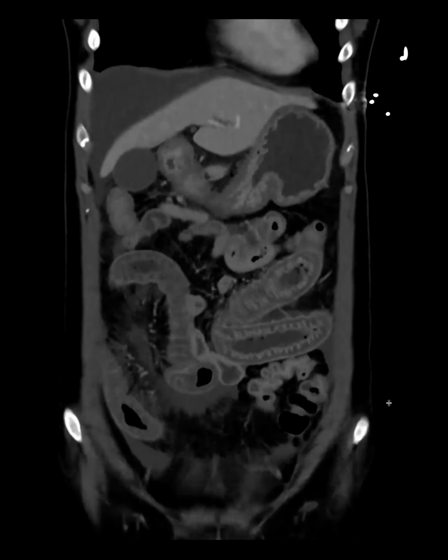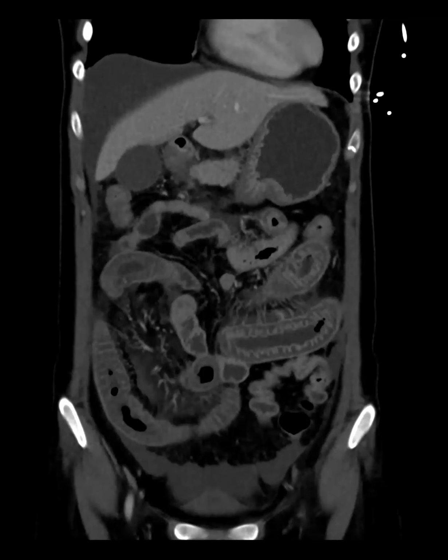So any takers for the findings on the CT that I'm trying to show? Feel free to unmute yourself and say something.